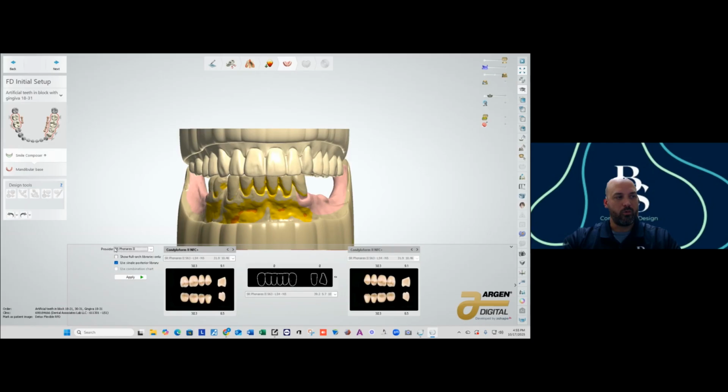So when I selected, for example, the Finars, when it loads here, I may get an error saying that I don't have licensing for it, or I won't be able to produce the output that I want because of my licensing on my dongle. So just be careful with those kinds of things. When you're selecting your tooth, you want to make sure that you get no errors when you select them. That way you know that you're going to be able to produce those teeth.